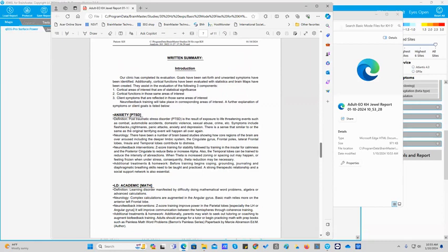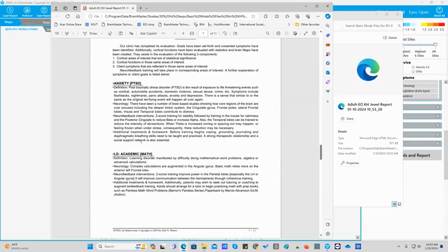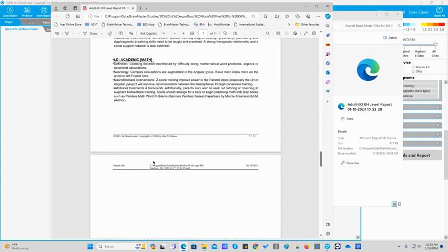It defines it. It gives you the basic neurological areas of the brain, typical neurofeedback interventions, and homework. And under math, which is completely different, again, we have a definition of dyscalculia, the neurology that's involved, neurofeedback interventions, and homework as well.